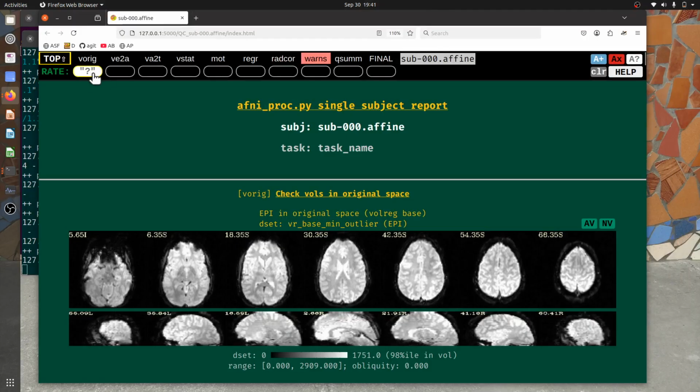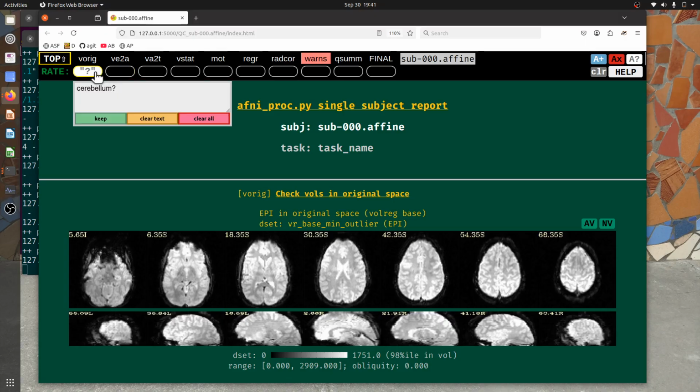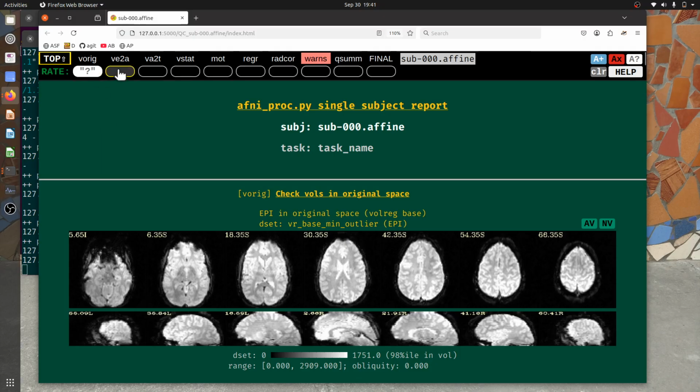We had started in the overview section about adding in ratings and comments. So if we click, we can add a rating. And if we control click, we can add text, or we can open this up to view the text. That's okay. What I'll do now is I'm just going to click clear here, or double click it, and that removes everything here. So you can't undo this, so I'm just going to do it now so we start with a clean slate.